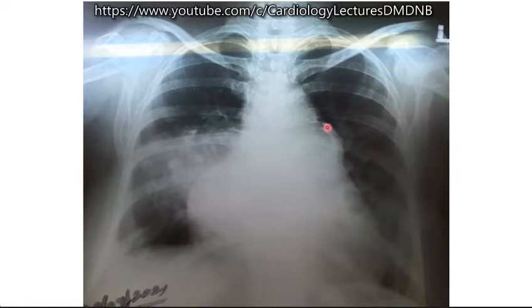And sir, there is a huge left atrial enlargement, sir. Yeah, there is a left atrium also. There is also the double shadow indicating that the left atrium also is enlarged. So enlargement of the left atrium is also a feature in favor of PDA, sir. PDA, not in favor of ASD because in ASD the left atrium is never enlarged. Then what will be your explanation for this oligemia of the left lung field?